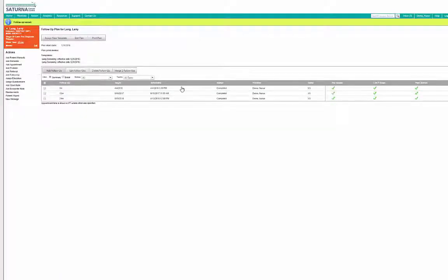The post-screen task is where I keep track of things that I want to be sure to complete after each screening. So, since I've sent the screening results to everyone who needs to know, I can mark these tasks complete. And now I'll set up the patient's next screening.